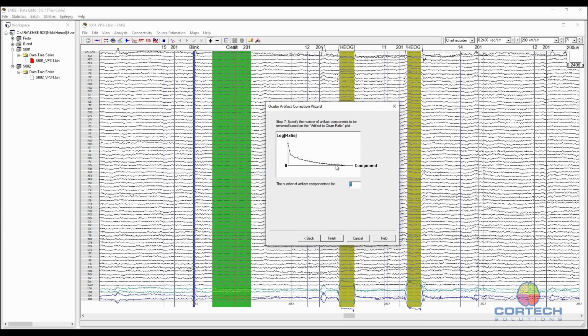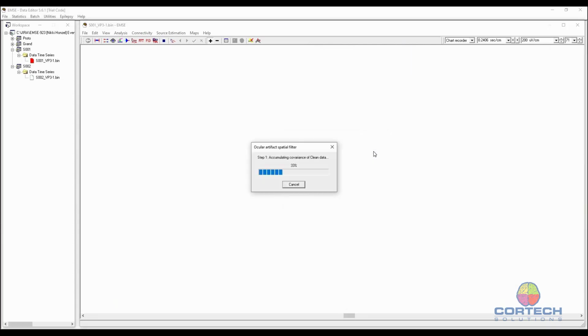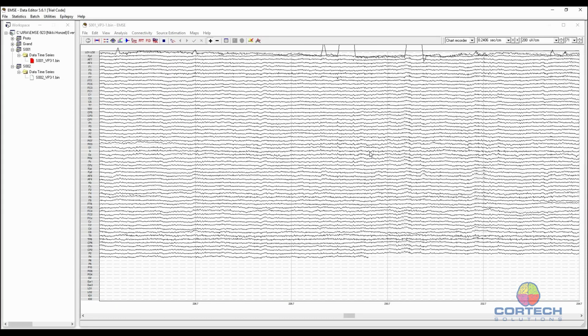Looking at this plot, these might be a little iffy, but we clearly have one component at least. Let's do just one. We might want to do up to 3. These two might get some subtle aspects, but let's see what happens with just one. One should be doing the lion's share of the work.